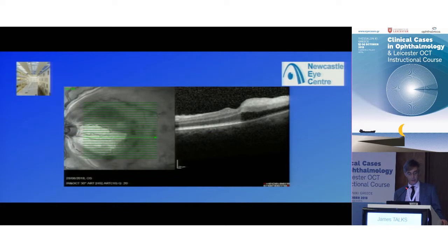So what's happening in this patient? This is half of it's gone swollen. Anybody know what this is? Any suggestions? Yeah, so you've had a central retinal artery occlusion. Remember, this scan goes that way, so you always look where the little arrow is. The scan goes that way. So this bit is here in the dark. That white area is actually the healthy retina, which is this part, so that's normal. The rest of it is all infarcted. So this is a central retinal artery occlusion with cilioretinal artery sparing. So that half is normal, this half is not. So it's quite a dramatic illustration of that.